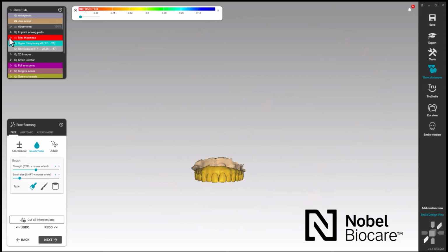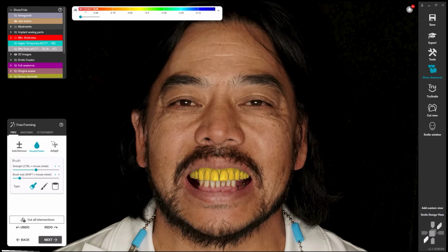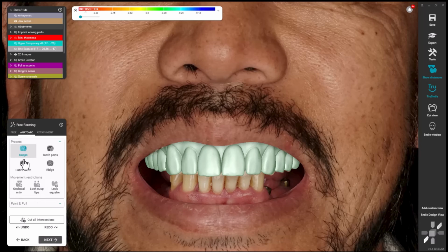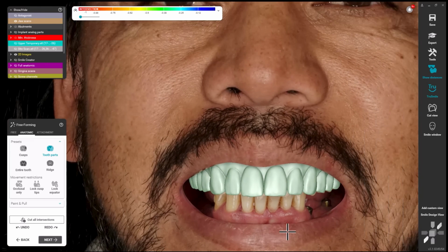So now I'm going to pull that photo back in, and I do that little fine tuning. So I turned on the True Smile, which gives me a little bit of different color and contrast to work with. And sometimes I like that for shadowing, and I can really go in and fine tune. Okay, so that was sticking out a little bit more than I wanted.